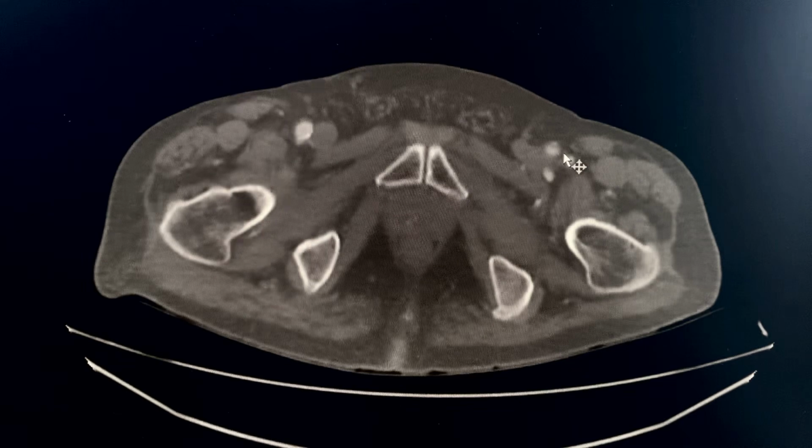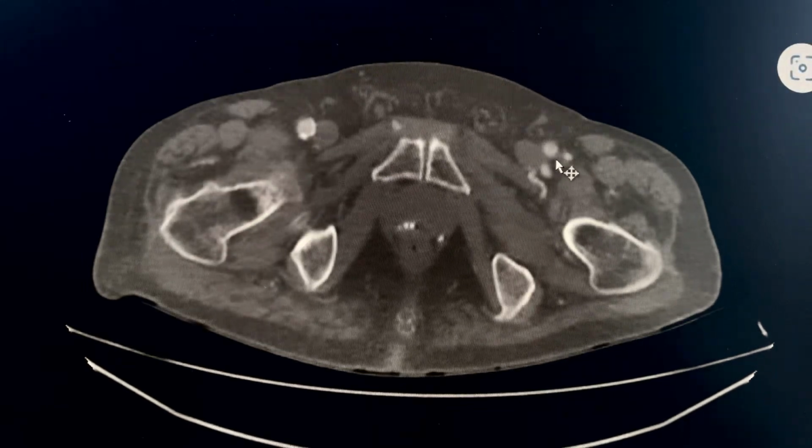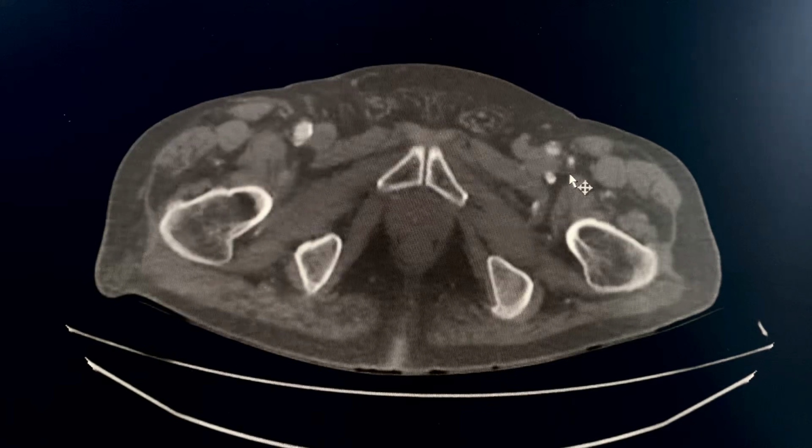This is acute thrombosis. This is a fresh thrombus from the heart that ended up in the superficial femoral artery. The good thing about this patient is the atherosclerotic changes are quite minimal. Therefore, it was possible to remove all these clots.